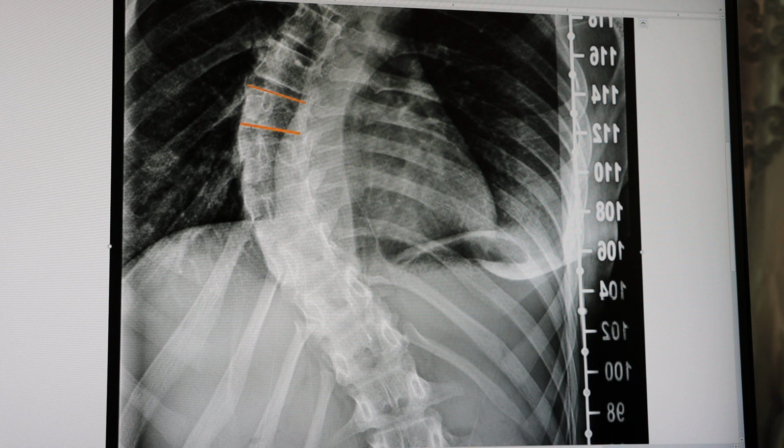And this is actually typical to be found in a scoliotic patient on an X-ray image. The reason behind that is the vertebrae of a scoliotic patient at some age; some of the theories explain that as related to the intervertebral discs.